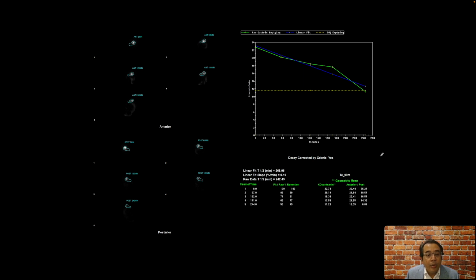All right, so this is our next patient, and here on this slide we're looking at multiple images of the stomach in the anterior and posterior projections. We've performed a gastric emptying study, and we are looking at the retention at several time points. And so here at the end of 4 hours, about 50% stays in the stomach. So this patient has severe gastroparesis.